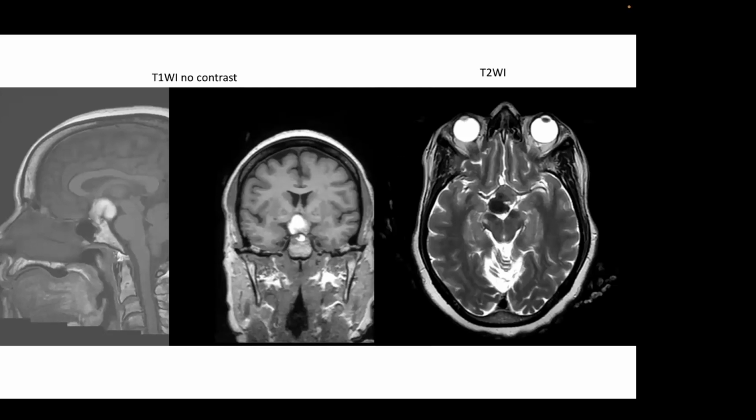Maybe. So I think aneurysm is a good thought, and I think we did a CTA because that was one of the concerns, that this was an aneurysm, and the CTA was normal. Oh, maybe melanoma. Melanoma is a very good thought, often bright on the T1 weighted scan from hemorrhage and can be dark on the T2 weighted scan. There's no history of melanoma here.